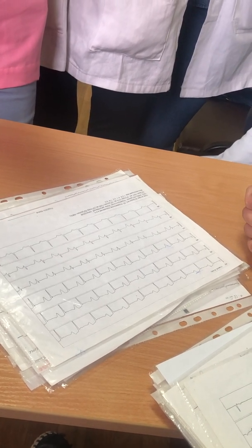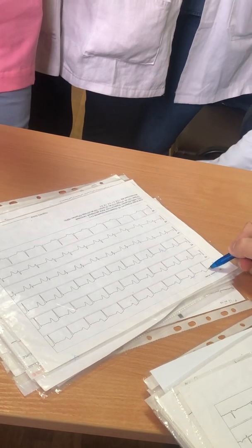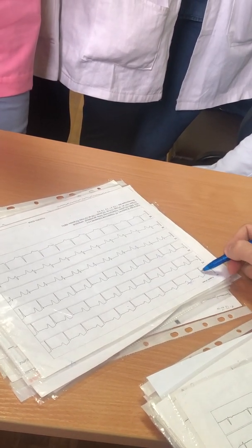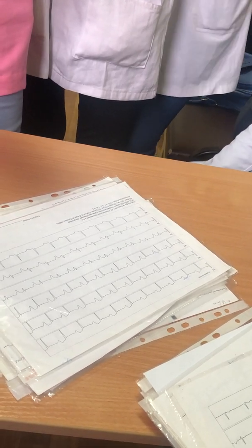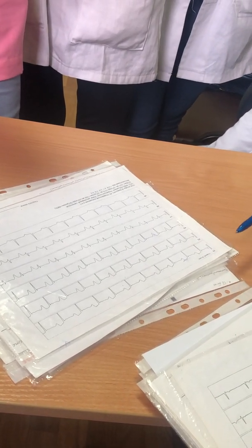If Q wave appears, it is myocardial infarction acute stage. Without Q wave, we cannot say about it. At this moment, Q wave is absent. It is S wave. We cannot differentiate if it is stenocardia or myocardial infarction. Our conclusion is acute coronary syndrome.